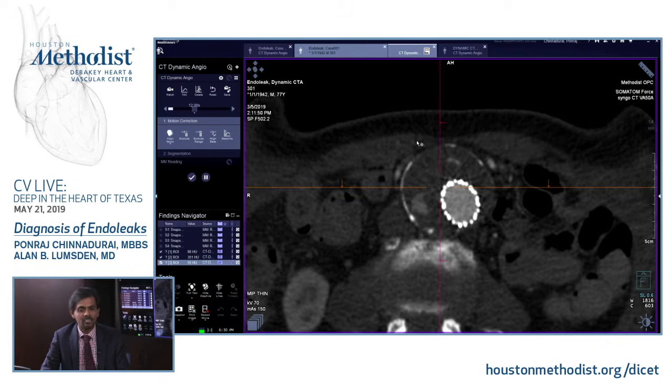So it really goes by the hemodynamics. We don't know, but there have been studies of patients which say that if you start your acquisition from, say, 4 to 6 seconds, you get a good arterial phase, and then if you stop at 20-25 seconds, you can probably rule out inflow from the IMAs and lumbar arteries. So there is no hard set rule.